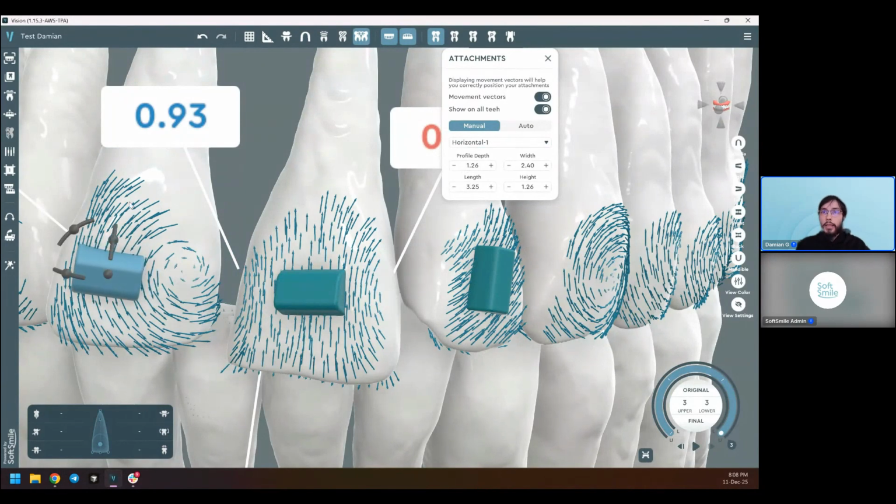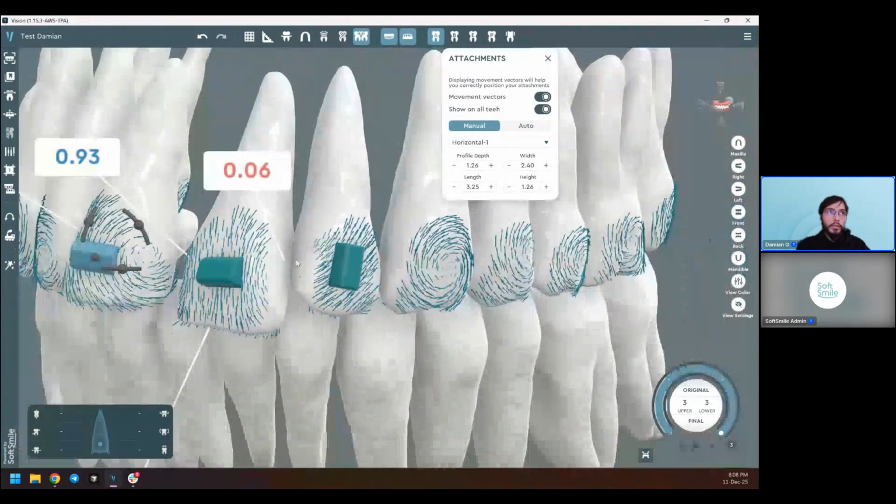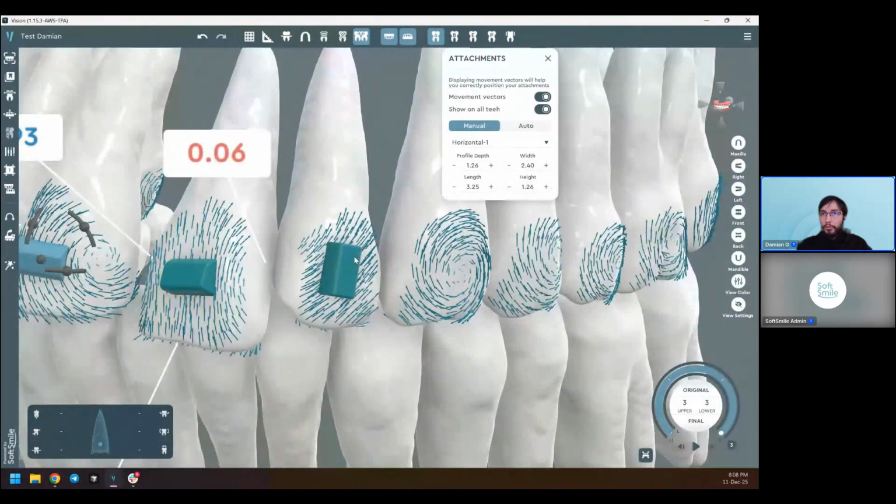And this is the guideline, right? So these are the arrows. These are the visual guidelines for you to look at when you're placing these attachments. If there's nothing else to take away from the webinar, these are the key two takeaways, the key rules of thumb that you can use when you're applying these attachments.